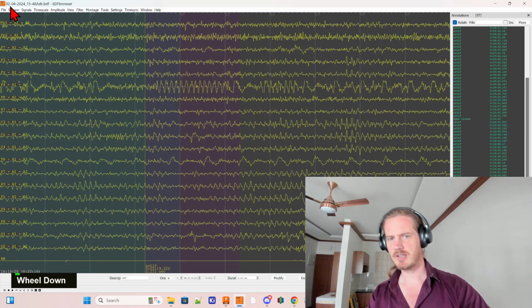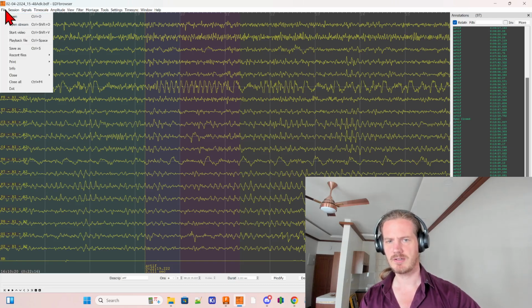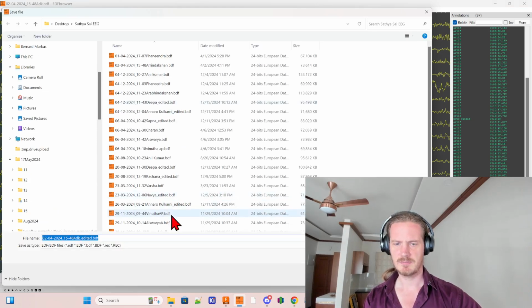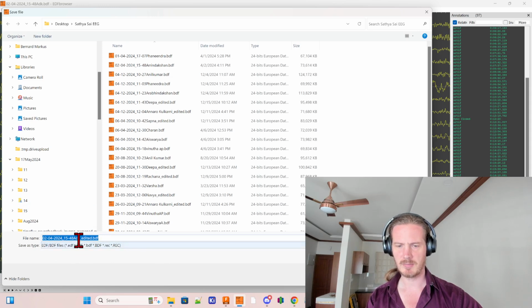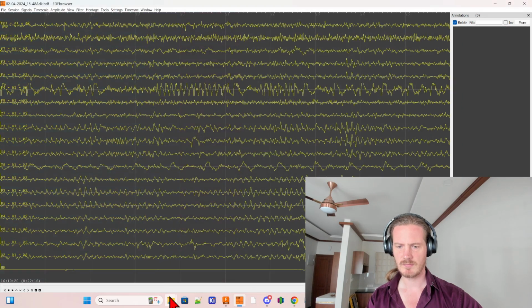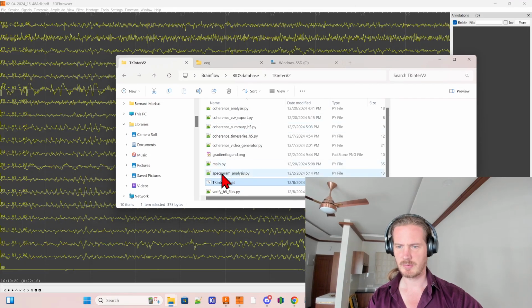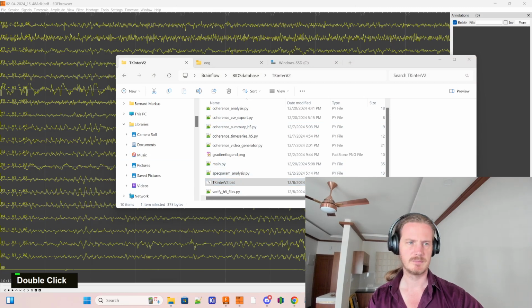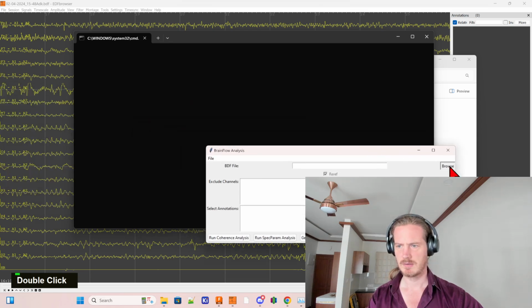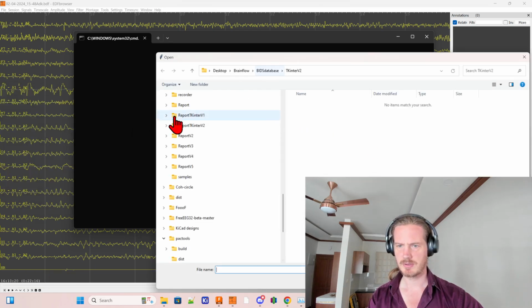All right, so I'm going to save this. File, save as, and I like to use its normal naming convention, so now it will be the original name _edited. Okay, save. And then let's take a look at what it looks like when we process this file. And browse.